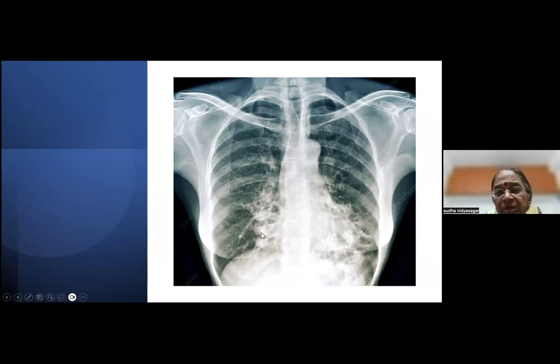So this patient must be having squeaky, leathery crepitations here. And that's what you would think of because it's basal. You're not going to think of post-tubercular bronchiectasis. Probably it's your usual bilateral basal bronchiectasis. Okay, fine. So let's go on to the next one.